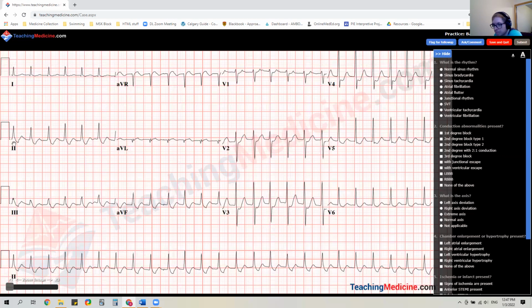Inferior. Q's absent. ST segment, depressed, depressed, depressed. T waves, normal, normal, normal. Anterior leads.